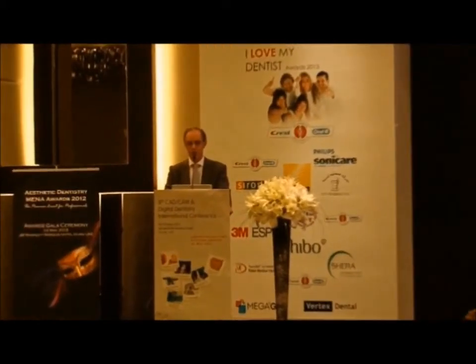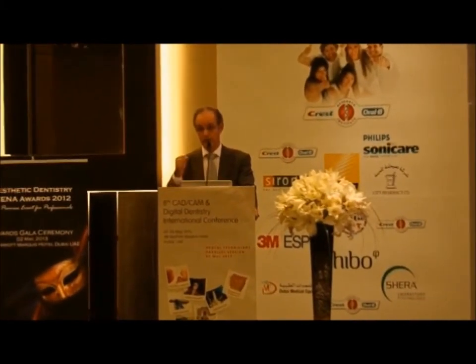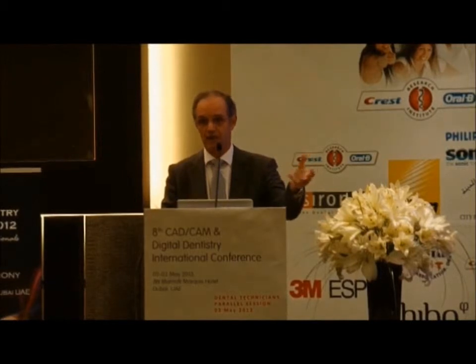The guide can be laying on the teeth and on the mucosa. For this, we need to have a strong support, and this will be a support done over a good image coming from a digital camera or plastic cast today if you don't have this. And the guide can be guided and supported on the mucosa for full cases, so you will not have to elevate a flap. You can work on the mucosa. These are some designs of guides that we can build up with the holes and the support.